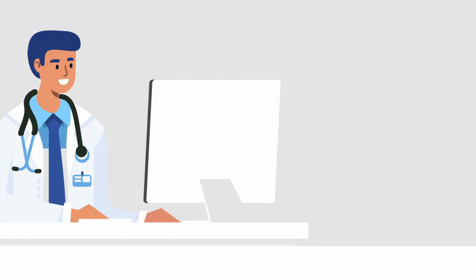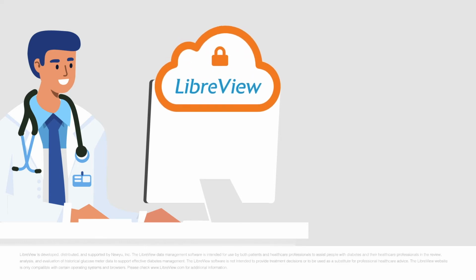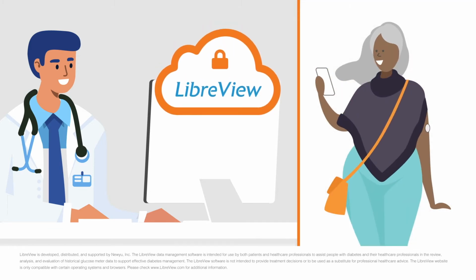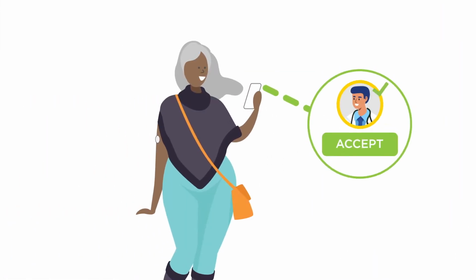Some healthcare providers use a system called LibreView, which is secure and cloud-based. This means they can review your glucose readings and provide treatment support in person or remotely, giving you the option to meet virtually. So, you share glucose readings and your provider sees everything in LibreView. Sounds simple, right? In order to set up a connection, you'll need to either accept an invitation from or initiate a connection with your healthcare provider.